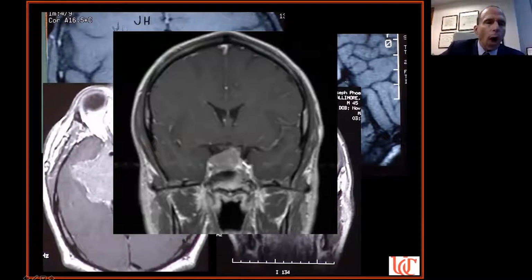And here's a smaller pituitary tumor coming right up and just hitting the distal left optic nerve. This patient presented with a unilateral optic neuropathy, but had a tumor that was just coming up. Here's the right side of the optic chiasm and distal nerve. It was just the way it was growing that gave us a left optic neuropathy. So pituitary tumors can do that.